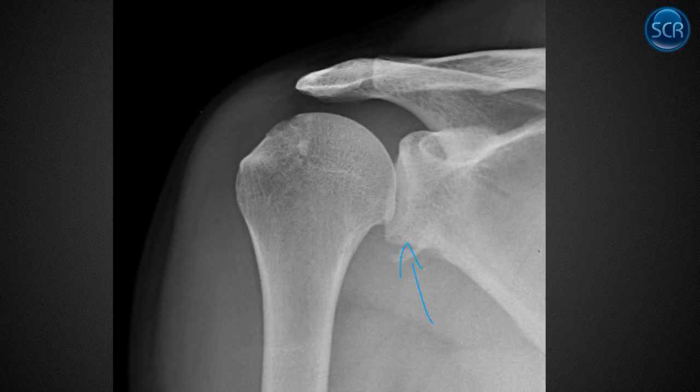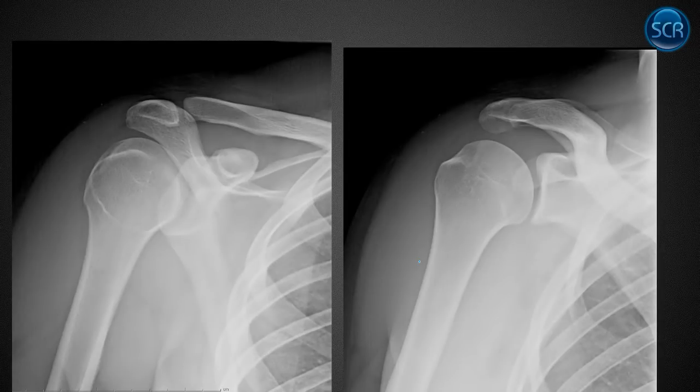All right, so this Bankart lesion often comes with a labral tear and may need arthroscopic surgery to treat. MR arthrogram is going to be the go-to modality to look for those, the extent of non-osseous injury, or an osseous injury for that matter. But, all right, so this is more of a classic case of a Hill-Sachs lesion.